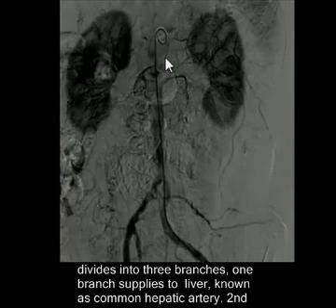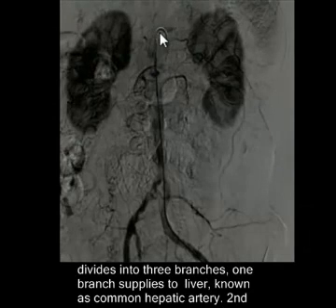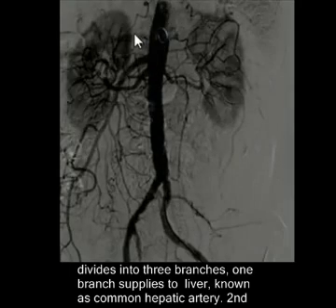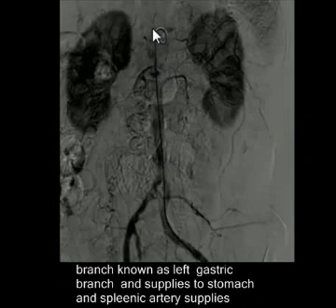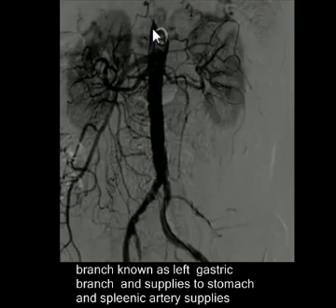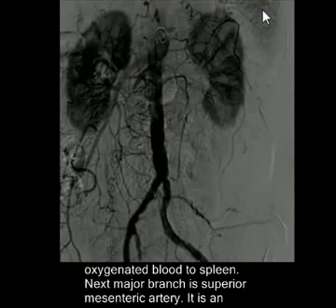The celiac artery is an anterior branch. It arises anteriorly from the aorta and divides into three branches. The first branch is known as the common hepatic artery. The second branch is known as the left gastric, which supplies the stomach. The common hepatic artery supplies the liver, and the third branch is the splenic artery, which supplies the spleen, of course.